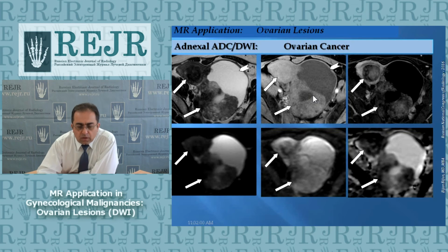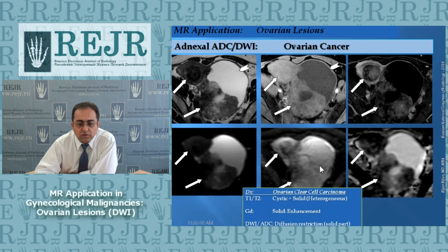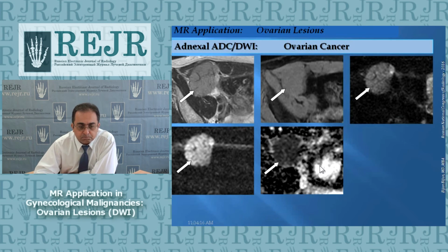Okay. Now let's take a look at this one. As you see here, it has a large cystic component as well as a solid component. And the solid component is the part that you have to check your DWI ADC in. And as you see here, it causes diffusion restriction in the solid component. Therefore, most likely it is malignant. And this is a case of ovarian clear cell carcinoma.